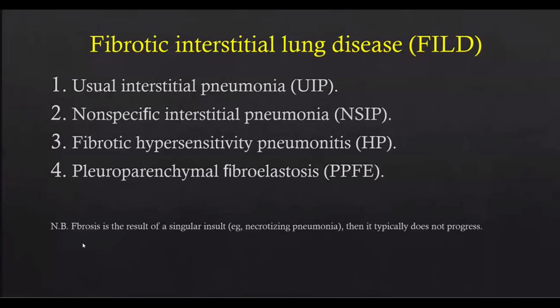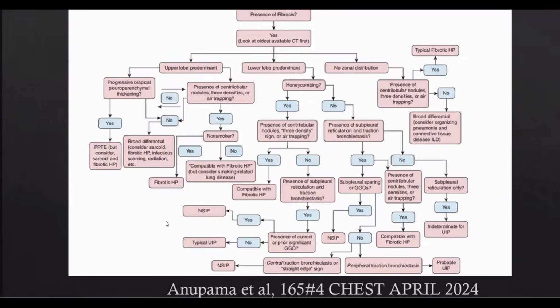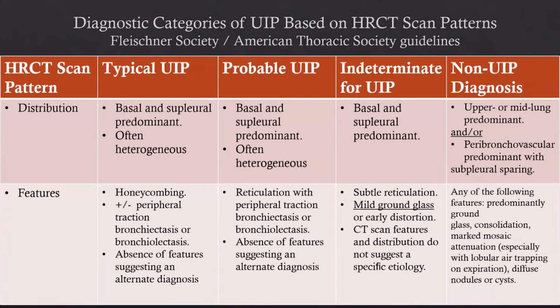Before diagnosing any case of fibrotic interstitial lung disease, exclude that we have fibrosis in one part of the lung only, as we saw in our first case today, old granulomatous infection. This one can be old infectious sequelae, and it will not progress, but those patterns can progress. Okay. Once we have any interstitial lung fibrotic changes, you should think at the beginning, is it UIP or not?